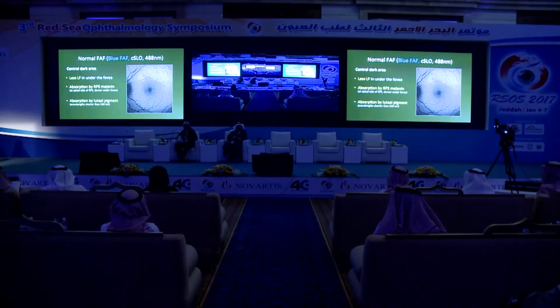Well, you recognize it by having a dark optic nerve and dark vessels, and then the central area is also dark, for three reasons. One of the reasons is that there is less lipofuscin in the retinal pigment epithelium under the fovea than the rest of the fundus, and also because, as you know, the RPE under the fovea is very highly packed with melanin, and the melanin blocks the light, so that's one reason, and also because you have absorption by the luteal pigment. So this central area of the macula is usually dark, and then around 10 degrees around that is the highest intensity of autofluorescence, and then you have a homogeneous autofluorescence over the rest of the fundus and the posterior pole.